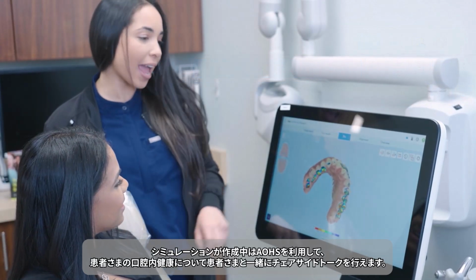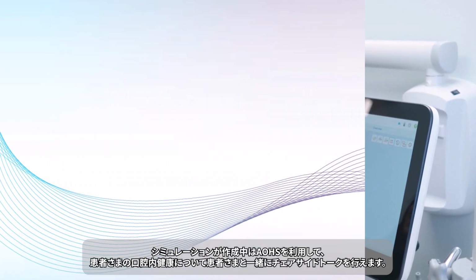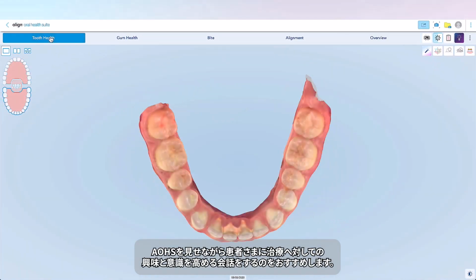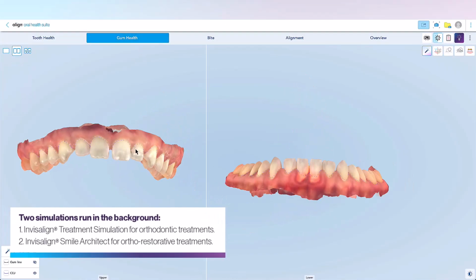While the simulation is calculating, you can use the Align Oral Health Suite tools to help the patient understand their current oral health status. We suggest using these tools to take the patient through each oral health condition step by step. This is an ideal time to build awareness and prepare them for a treatment discussion.